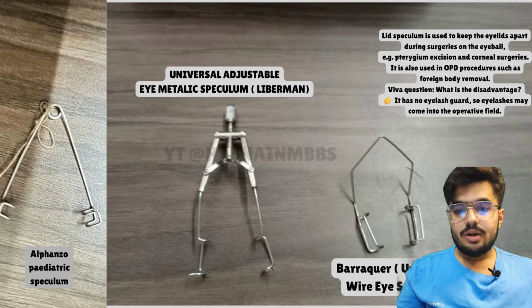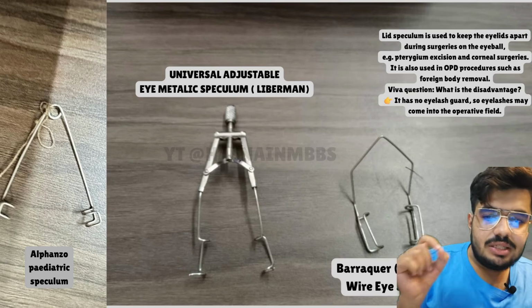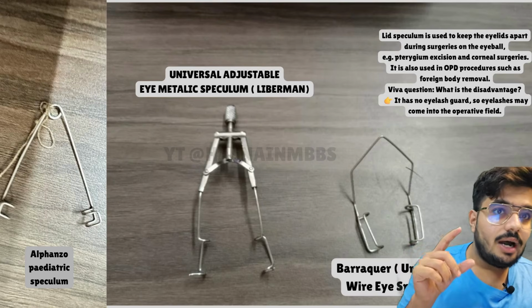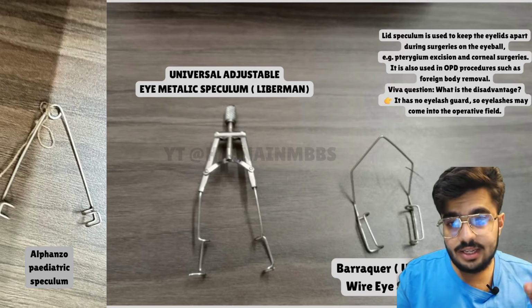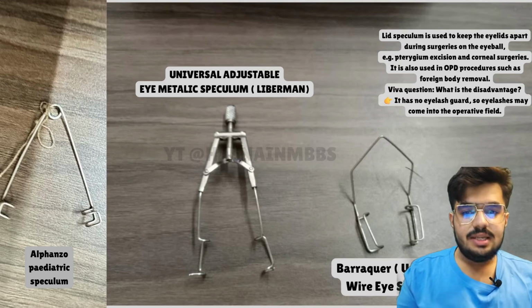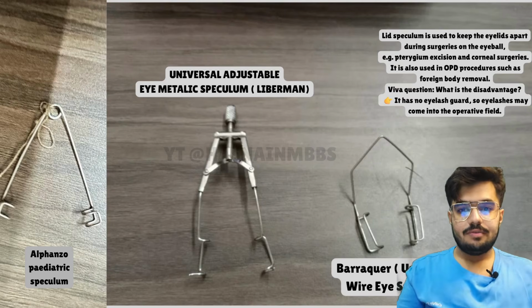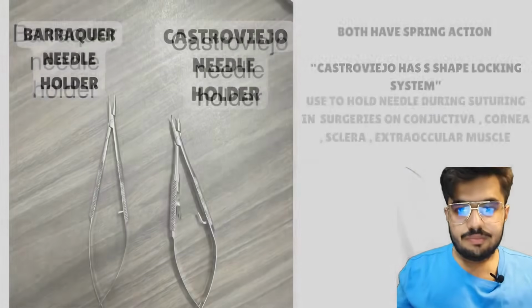Examiner may ask you what are the disadvantages of this eye speculum. The disadvantage of this eye speculum is that it doesn't have a guard. So if there is no guard in the eye speculum, the eyelashes may come into the operative field. So this is the disadvantage of the eye speculum. So now let's go further.